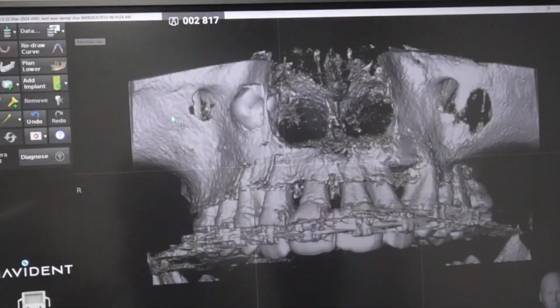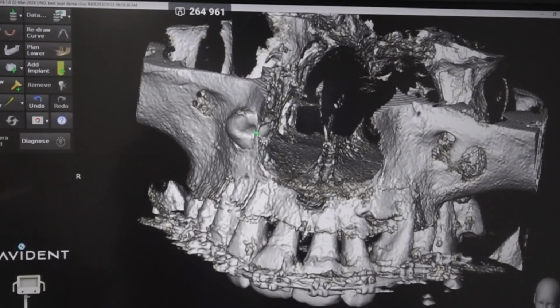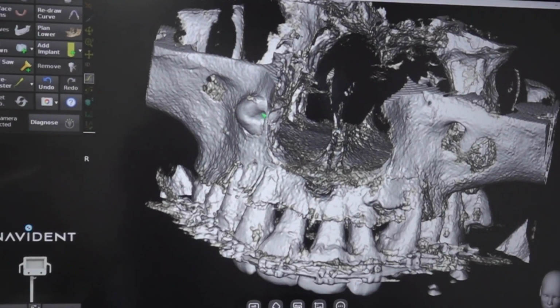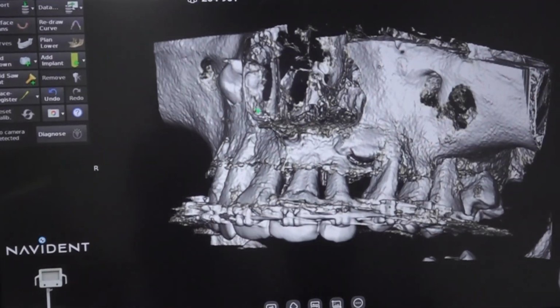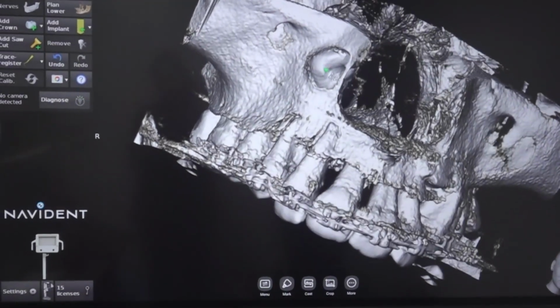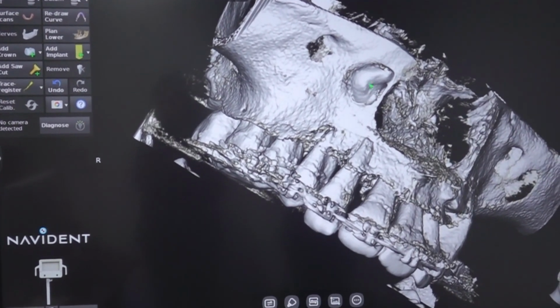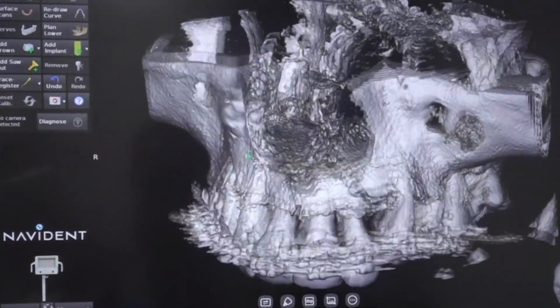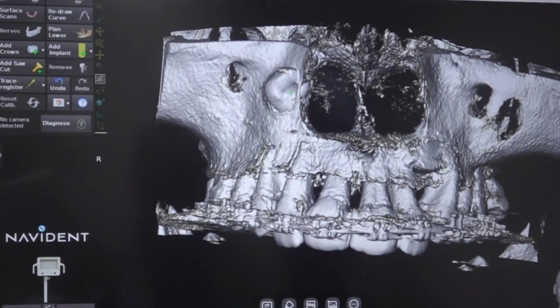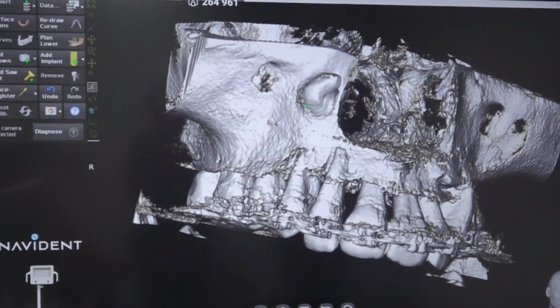We'll see the reformatted image. So, you know, the canine is like a person traveling in a bus, on the steps. One leg will be outside the bus and one will be inside the bus. He is traveling partly inside the nasal cavity and partly outside the nasal cavity. So if you palpate here extraorally, you will feel the bulge. Okay. It is exactly in the nasomaxillary buttress. You cannot take anchorage. Even if you retain it or not retain it, you cannot use this bone.